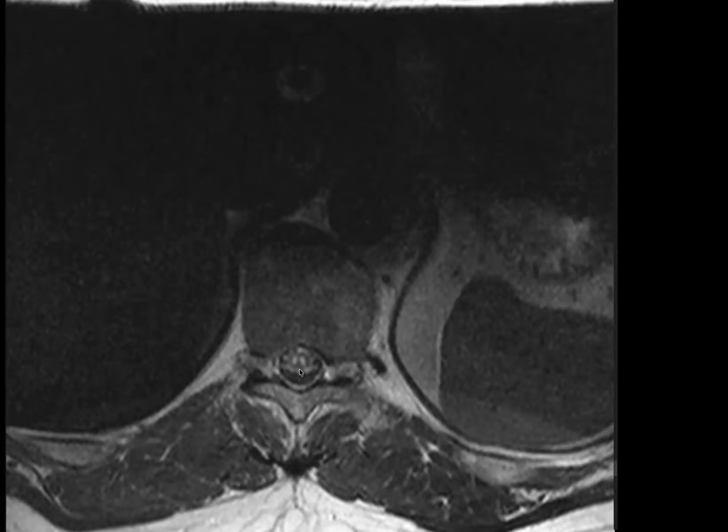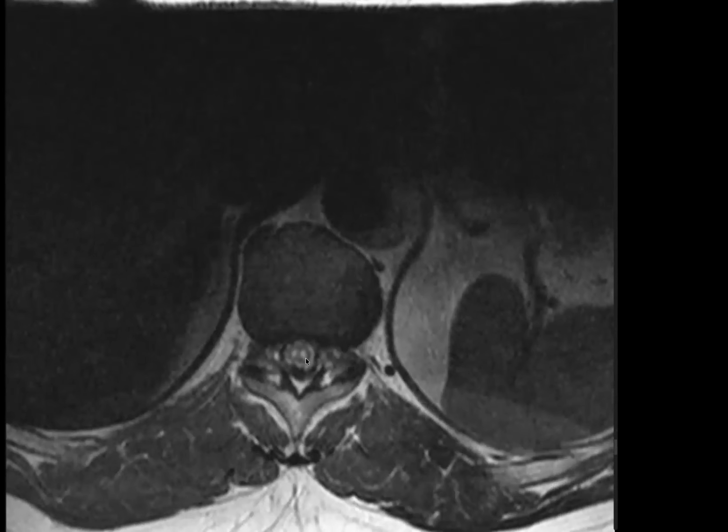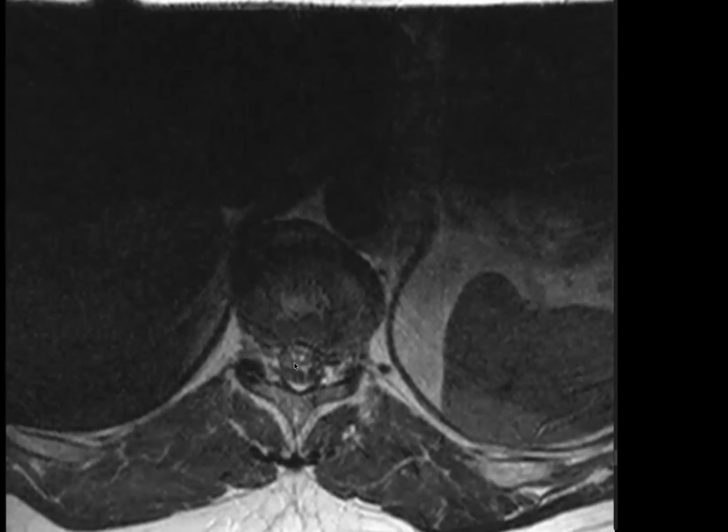I think there's a sign named after it, like owl's eye sign or eye of the owl sign or whatever you want to call it. But again, that's not important. The fact is it's bilateral, and I know it's not a very high quality image, but this is anterior cord. If it were posterior cord, you would get to see it sort of here. So anterior cord, bilateral, young man, acute.